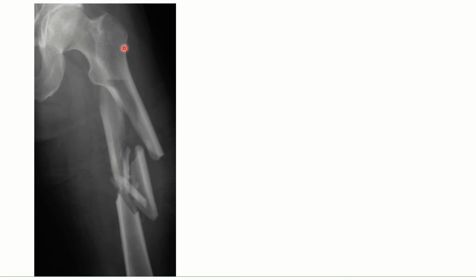So coming to the next case, here comes an X-ray like this. Again, the name of the patient and the date are missing. We'll consider that the name is there on the X-ray because the whole of the X-ray could not be put up. So the name of the patient is printed on the X-ray along with the date. So here we can see this.